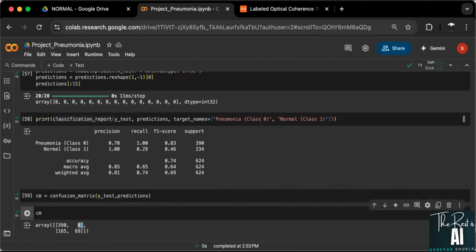Getting 0 over here, so not too inspiring, but maybe try to get some correctly predicted classes, try to visualize them, try to see what the prediction was and what we got, visually see the results. So let us do those here.